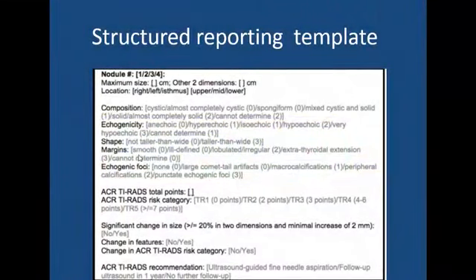So the TIRAD report will be like this. I will mention the maximum diameter, the location of the nodule, then I will go through all the categories.